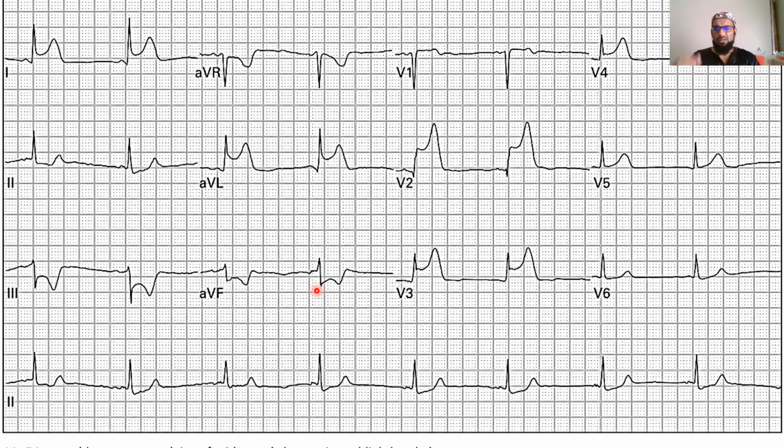It's for those cardiologists earning 4,000 Rand per consultation. Let them sit and work out exact degrees. We need to get our patients in and out. So we know that we've got a left-sided axis, all right? It's still within normal, but it's a left-sided axis.